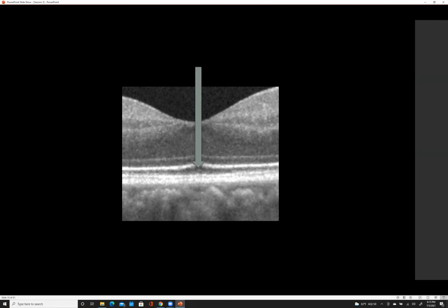I don't know why I have that repeated. How about that one? Dark. Good. So that layer there, that heterogeneous layer, is dark. How about that? Light. Yes, light. Exactly. And underneath it is also light. Yeah. Correct.